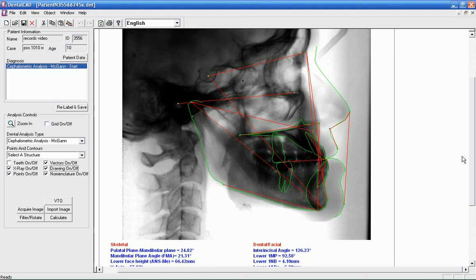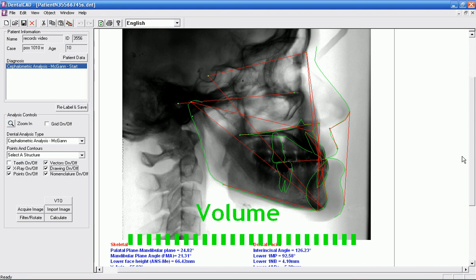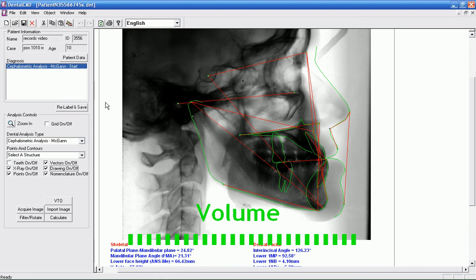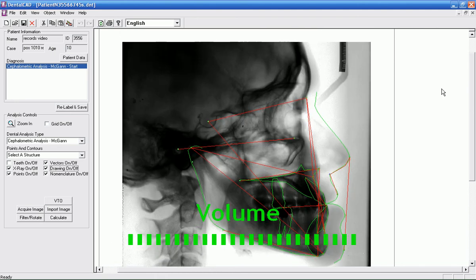You first look at the lips, at the sublabial points, then you turn off the drawing, turn back on the points to edit the points, and then you're through with that. Okay, have we covered just about everything? Yes, I think the saving, magnification, cropping, filtering, the sublabial points, editing, and even the calibration for those of you that have a digital ceph. If you do not have a digital ceph, then you don't have to do that.